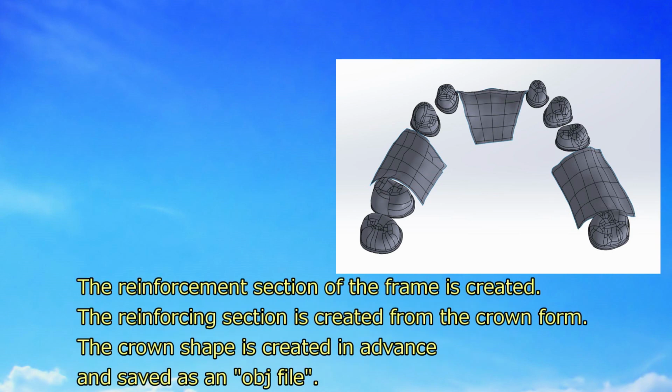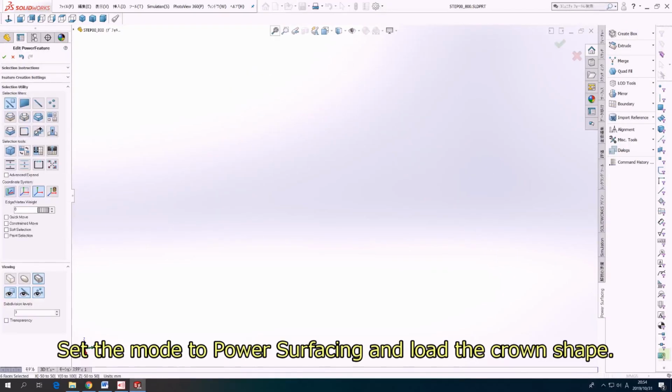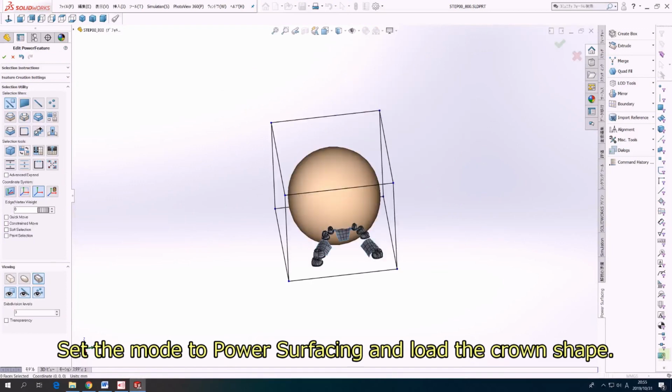The reinforcement section of the frame is created. The reinforcing section is created from the crown form. The crown shape is created in advance and saved as an obj file. Set the mode to power surfacing and load the crown shape.